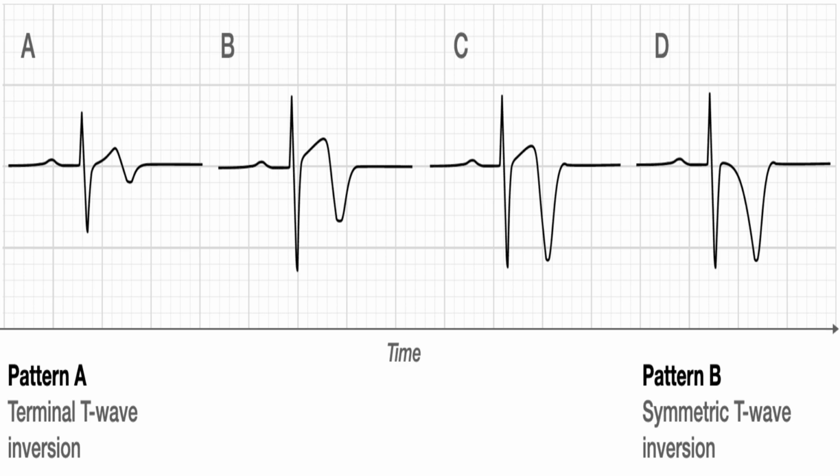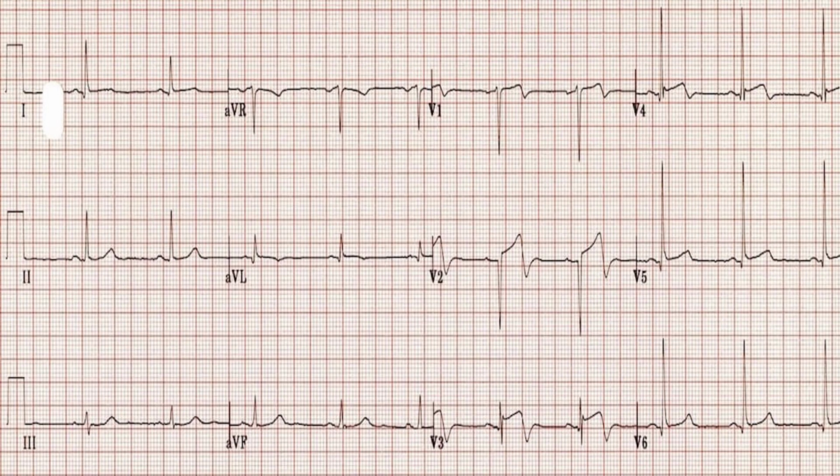So a patient comes to you and says, "Yesterday I was having chest pain, restlessness, perspiration, but then I got normal. I don't want to take any risk, please do my ECG." You do the ECG and you see a biphasic T wave or T wave inversion in V2 and V3, then it's alarming. Now you will conclude that the LAD must be critically occluded. You go for angiography, not echography, right? Very good.